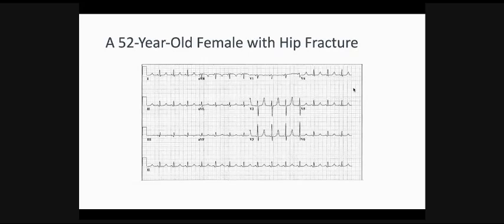And of course, you should go over it systematically. So you go with the first P wave, and then the rate, and then the rhythm, the axis, and then look at the QRS complexes, the T waves, and then the intervals. And at that point, you should have a clear diagnosis in your mind. All right. And feel free to punch in or just write your comments on the chat box.